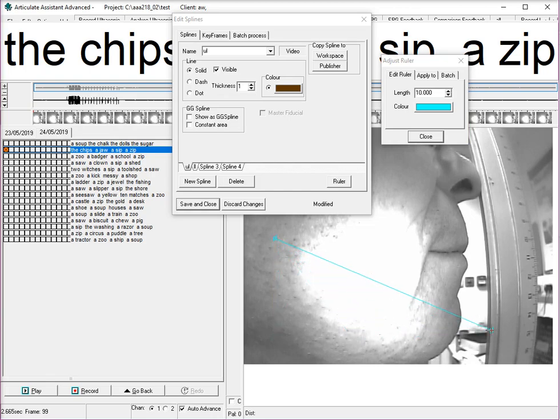We drag the ends of that over to the real world ruler here, and for instance measure from say there to there, and that is going to be 1, 2, 3, 4, 5 centimeters. So if we have this in millimeters, then that would be 50. So we set the length of that blue line to 50 millimeters, and that will define the scale.